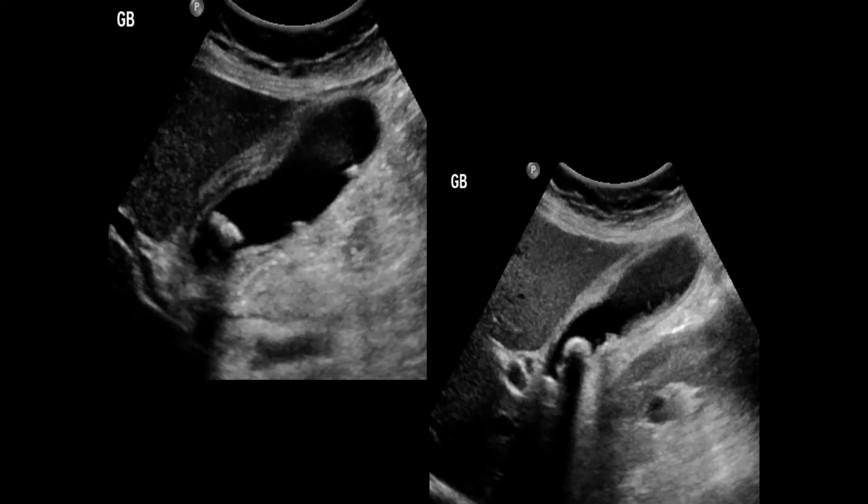Sometimes the patient is an ICU patient, unconscious, and they can have fluid overload. They can have thickening of the gallbladder wall, and they might have incidental stones, and they have a distended gallbladder due to prolonged fasting. And you don't know, is this acute cholecystitis or just incidental thickening? So the way to go through this, if you cannot elicit the tenderness over the gallbladder, you can always go for a HIDA scan to assess acute cholecystitis.